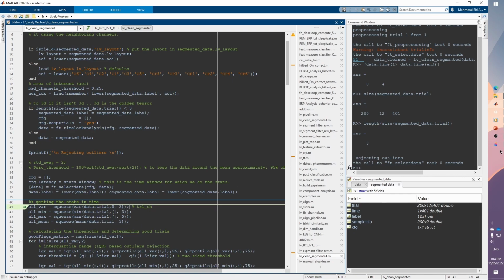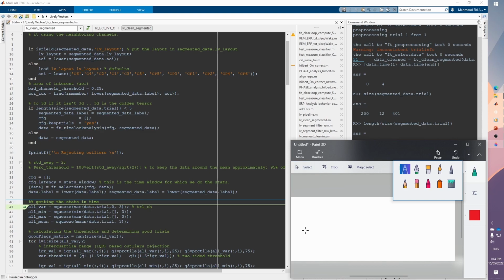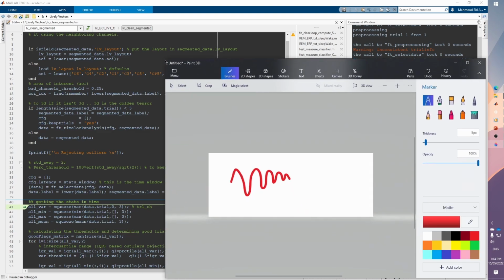So what the variance is actually doing is something that looks like that. We basically have, let's say, our signal looking like that, and we have to calculate the variance. So we can imagine that this is the mean of all the data points, and if we are centering our data, this will be of zero mean.